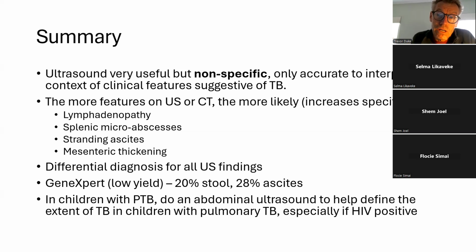So I think, just to summarize, abdominal ultrasound can strongly augment, it can add to the clinical diagnosis of tuberculosis.